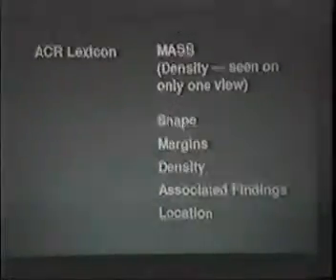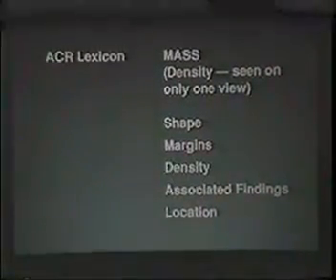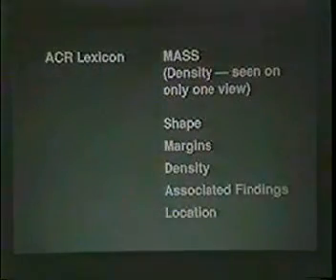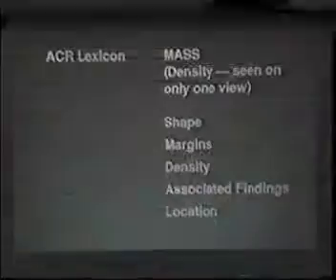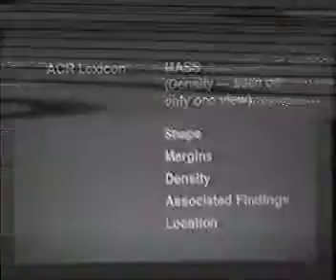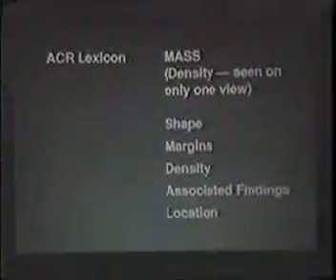Now, the American College of Radiology, in its lexicon, has set up a series of descriptors to give some uniformity to the mammography report, firstly, and secondly, and I think perhaps even more importantly, to tell us what words we need to go through in order to train our eyes so that we make the appropriate assessment of a lesion on mammography. And I think if you use the right words, or if you force yourself to use a limited number of words, the words that you choose, if you listen to them or if you look at them after you're done choosing them, will actually tell you what it is you need to do with the lesion.